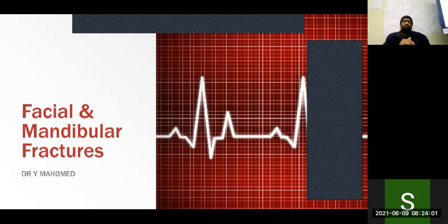Okay. So today we're going to learn how to look at those facial x-rays. We're going to go through a bit of the mandible as well. And then next week we've got a part 2. We're going to cover it in a bit more depth as well, right? A little bit more theory and things like that. But the first thing we need to understand is what is the face.